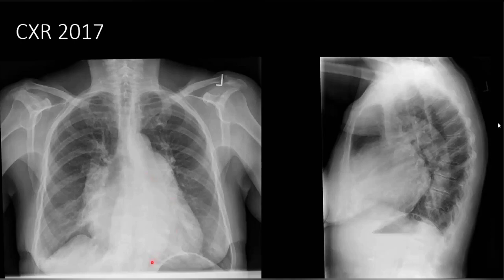So how would you explain this retrocardiac opacity into sarcoid? And this patient is a young female. Although we don't find any pectus, esophagus is not in the spectrum of sarcoidosis, and esophageal involvement is in scleroderma. Yes, sir, that's not in sarcoidosis. I don't think so. This is lymphadenopathy, is it?